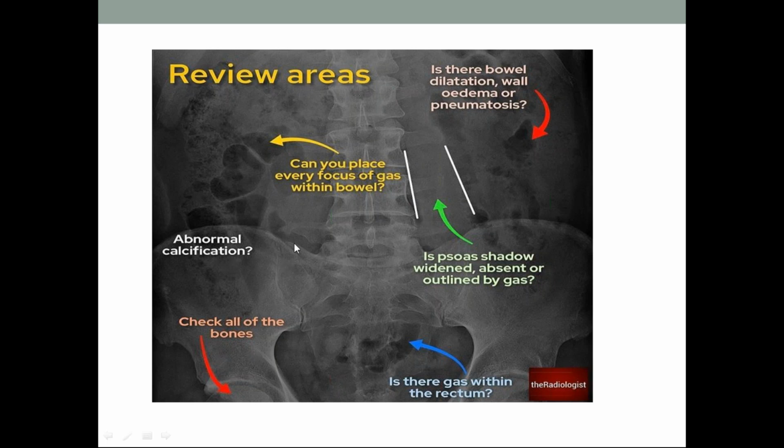And look for any abdominal calcifications. In this area, the appendix, if it is calcified, and sometimes you will find calcifications in the bowel itself, and sometimes foreign body calcifications, and sometimes a bezoar also, if they calcify. And apart from that, the last thing we have to see clearly is the gas.